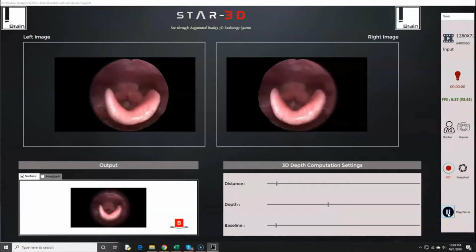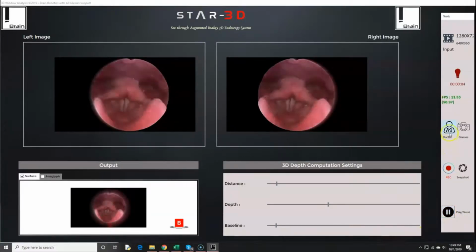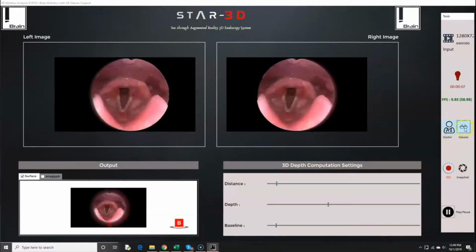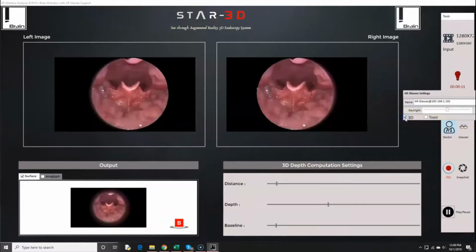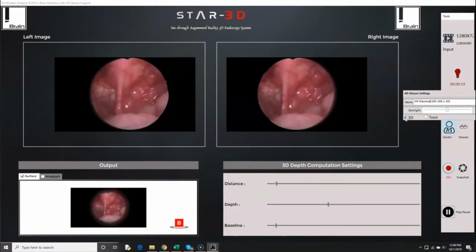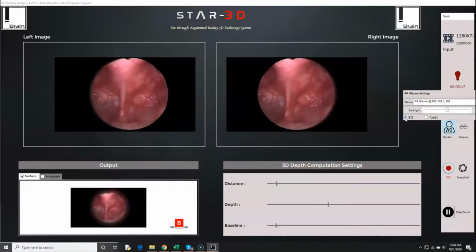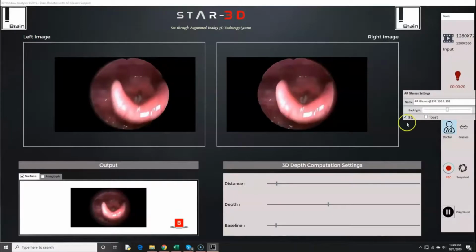In order to see what we are seeing on the screen, we will go to Doctor in the toolbar, select Glasses, and 3D. Now we are seeing what's on the screen in 3D on our 120-inch high-definition virtual screen in the augmented reality glasses.